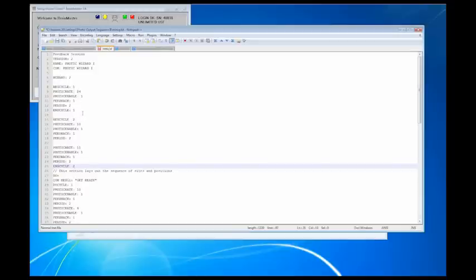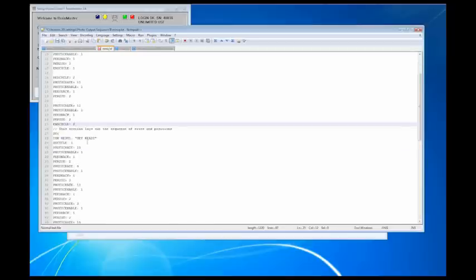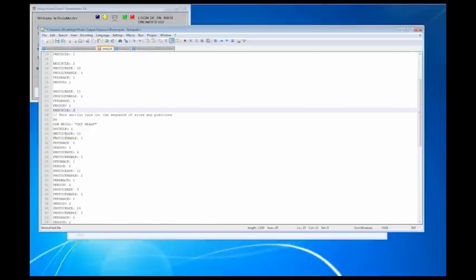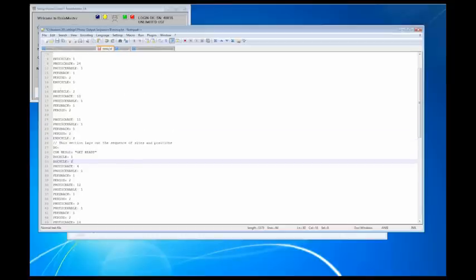Okay, so now I've created a cycle that may have more than one period of different rates that you're going at. So let's just say I delete this now. I go do cycle 2. So now when it does cycle 1, it's going to be at a photic rate of 24. It's going to be on. Feedback is 1.